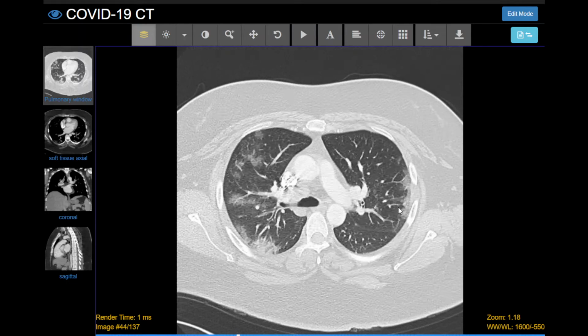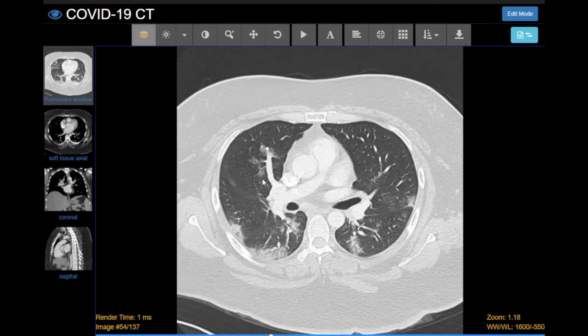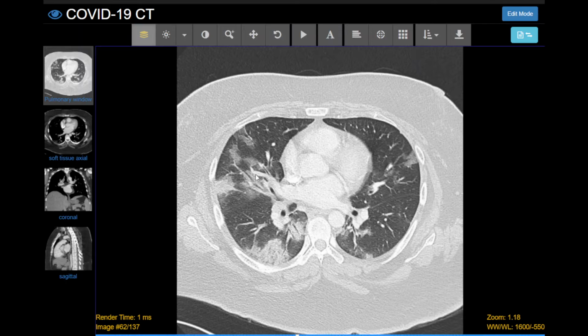surface. There's also a bronchovascular predominance, where you see these opacities surrounding the bronchi as they are here. Here's another good look of some that are surrounding the bronchi. So this is a fairly common pattern with COVID pneumonia.